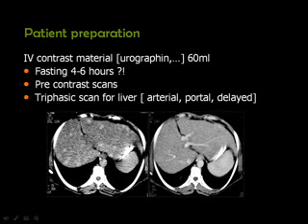How you know that this patient is injected or not? Just look to the aorta. If the aorta is not containing contrast material, this is the pre-contrast scan. Then in the post-contrast scan, you can see that the aorta is stained with the intravenously injected contrast material. Also, you can see the contrast material running in the vessels inside the liver.